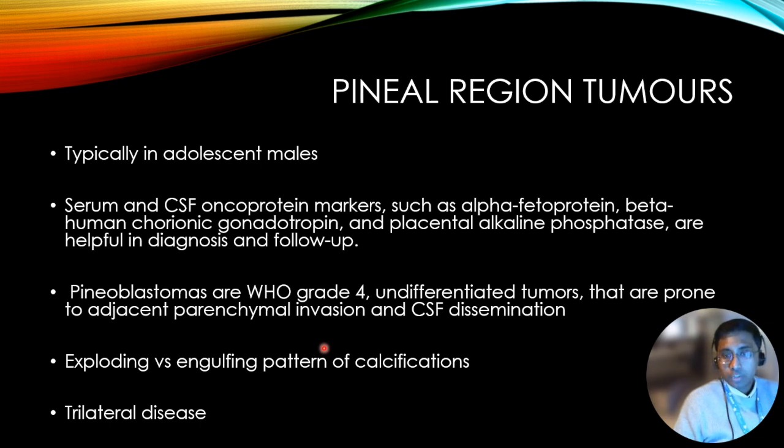The two patterns of calcification described here are the exploding versus the engulfing pattern of calcification. So we typically have the blastomas which show the exploding pattern and the germ cell tumors which have an engulfing pattern of calcifications. And many a time whenever we have a pineal region mass, it is very important that we check the suprasellar region and also the eyes for retinoblastomas.